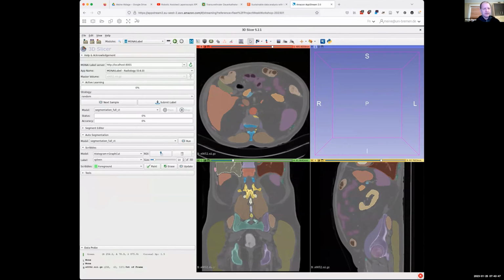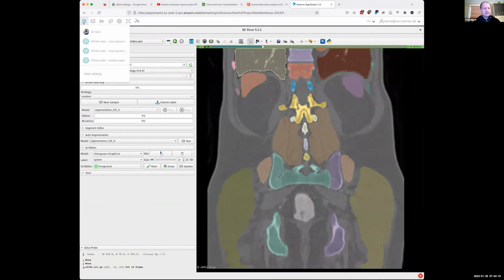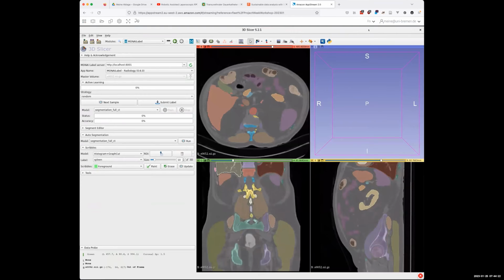It still looks like it doesn't work. Oh no, this works, but the Slicer buttons don't work. Also, I didn't purposely change the view here. Is it possible that I have started multiple Slicers? That could be. I think you double clicked on the view. If you double click again on the slice view, is it restored? Oh yeah, so I double clicked somewhere here. Right, I think it always thinks that it's in this view.